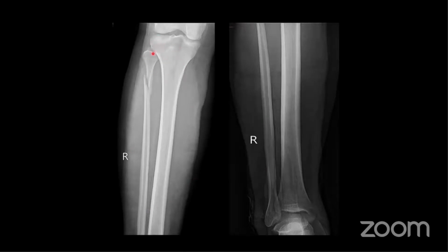So there's a fracture of the proximal fibula here, which is quite obvious. Say you saw this at the bottom of a knee X-ray, then what you need to do is ask for the ankle to be imaged as well, so you can look for the second injury.